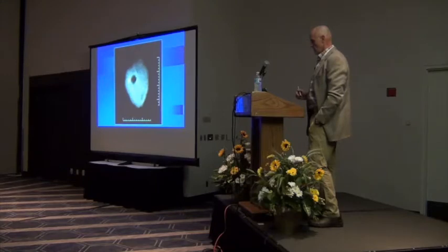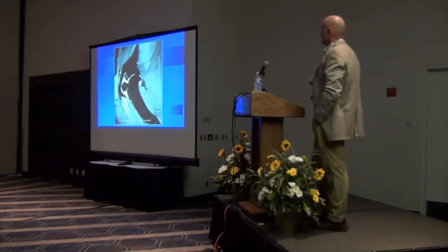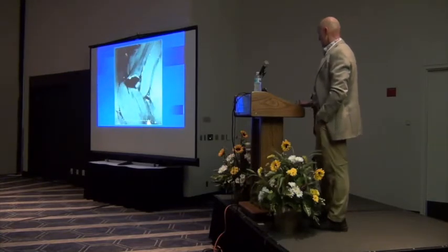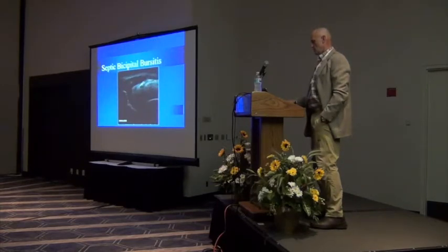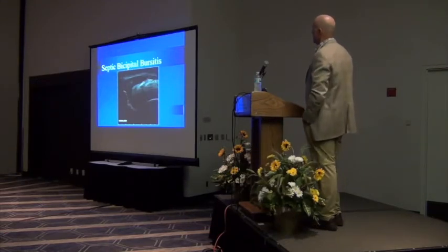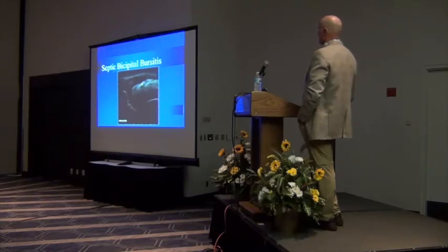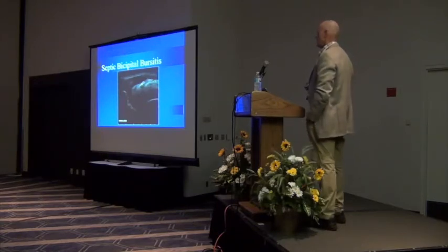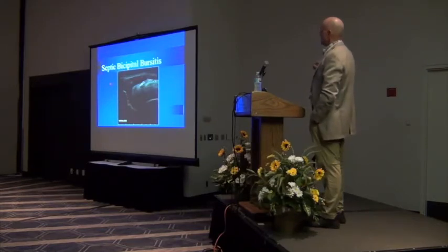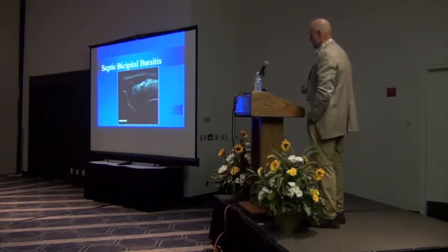So again, look at the sagittal view, and I don't know that you can see the bone edema near as well in this as you can in the transverse view, but certainly a lot of fluid around there. And I only use that as a reference for what things could look like. Now this was a horse that came in just recently, came in with a puncture wound into the bursa. This is the lateral lobe. There's already a irregularity to this. I don't remember how long it had been there. I think 3 weeks before it presented. So we've got a lot of fluid and hypertrophic synovial membrane in this bursa.